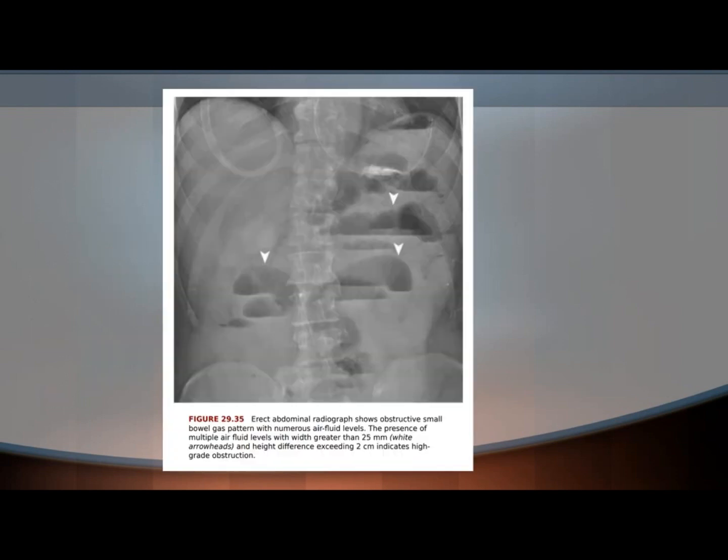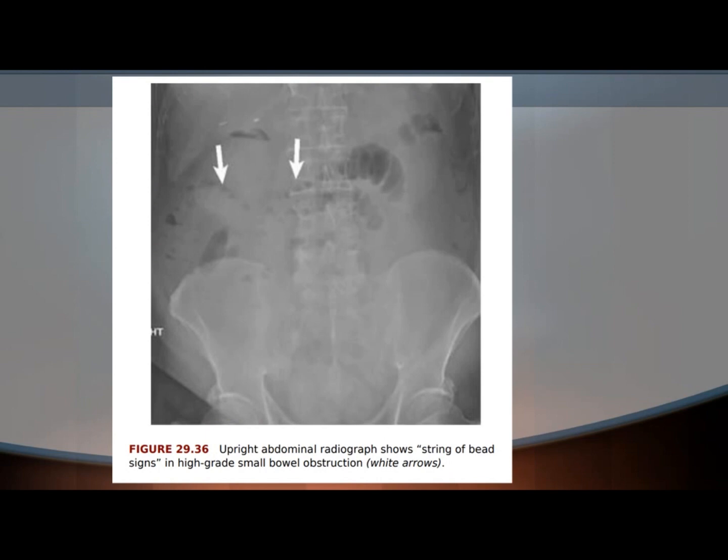Next, please. So we have here an X-ray. It shows multiple air fluid levels in the center of the abdomen. I think everybody knows that the small bowel occupies the center of the abdomen and it's framed by the colon. So normally we can have air fluid levels in the colon, but whenever they are big, large, and multiple, we can say it's dilated. When you have 2 air fluid levels more than 5 cm or 5 air fluid levels more than 2 cm, you can say this is obstructed small bowel or dilated.